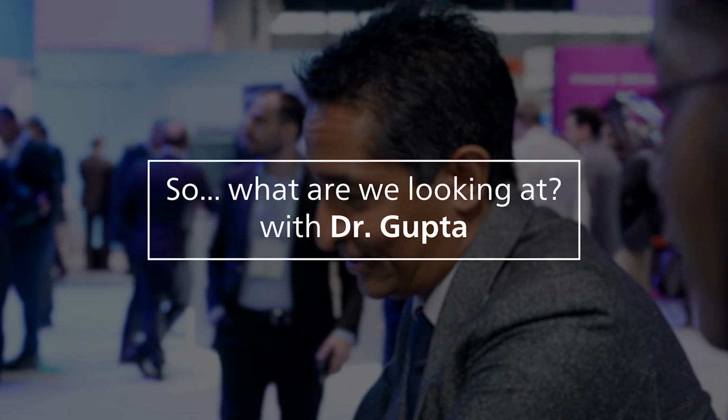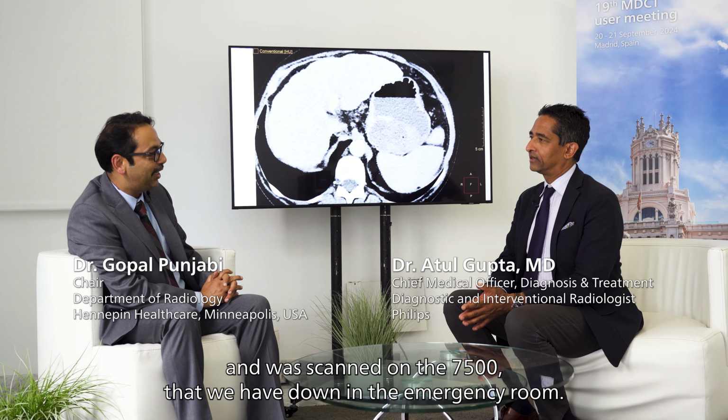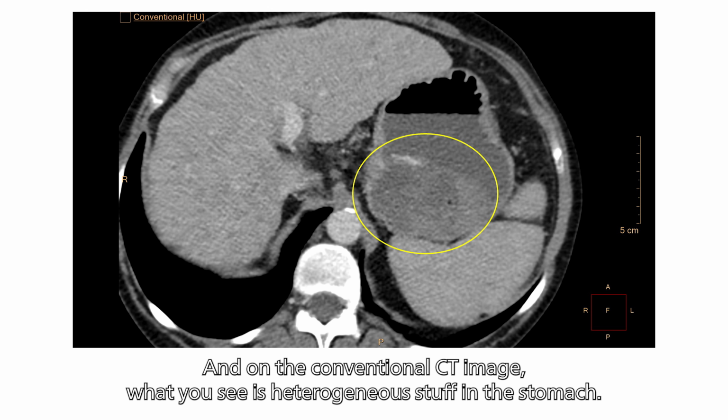So, what are we looking at? Gopal, tell me what I'm looking at. So this was a patient that came to the ER for abdominal pain and was scanned on the 7500 that we have down in the emergency room. And on the conventional CT image, what you see is heterogeneous stuff in the stomach.